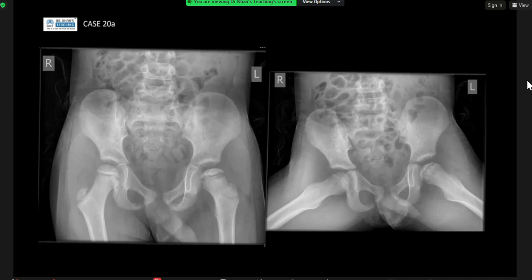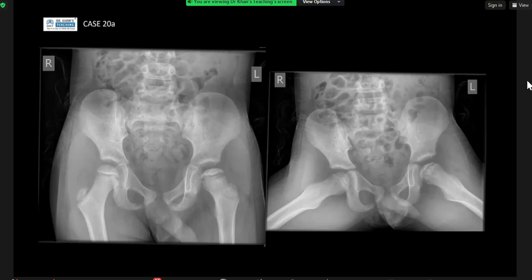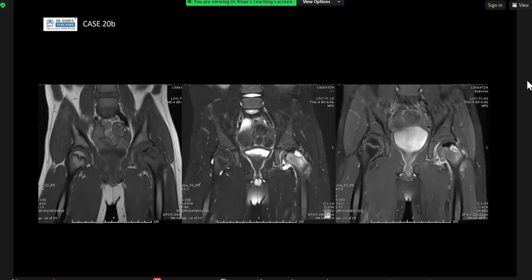This is a pelvic X-ray for a skeletally immature patient, showing at the left hip a widening of the joint space, and the left femoral head epiphysis is decreased in size and increased in density, showing sclerosis. The growth plates appear good. So the findings are most likely suggestive of Perthes disease, AVN of the left femoral head epiphysis, due to decrease and collapse of the left femoral head epiphysis. The widening of the joint space, which is joint effusion, is the early sign. Okay, good.